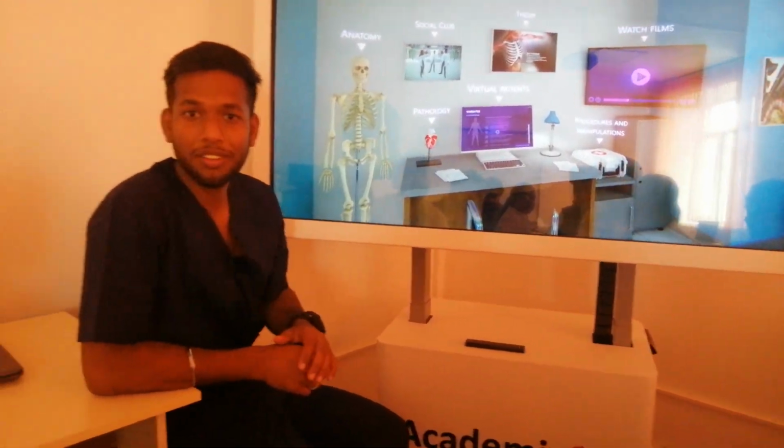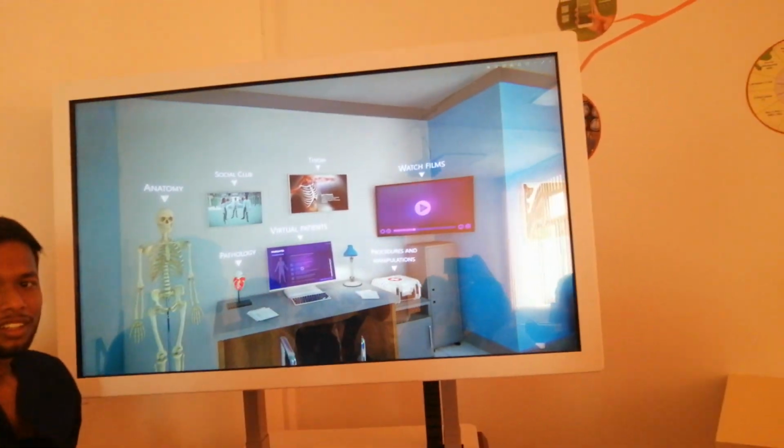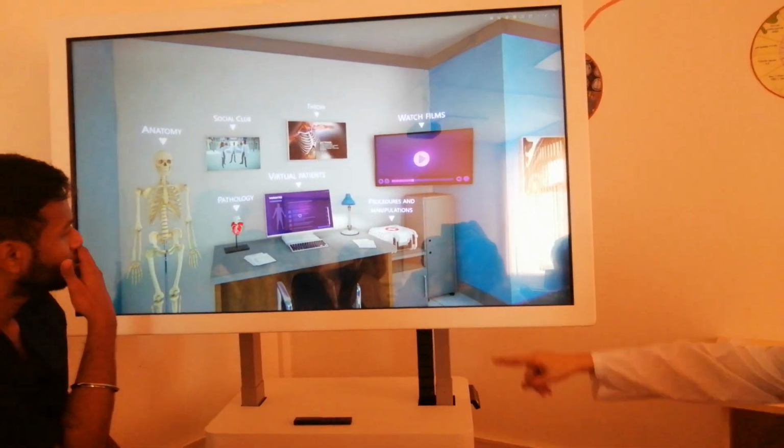Your name? Mushraf, your group number? Okay, please click by procedures and manipulations.